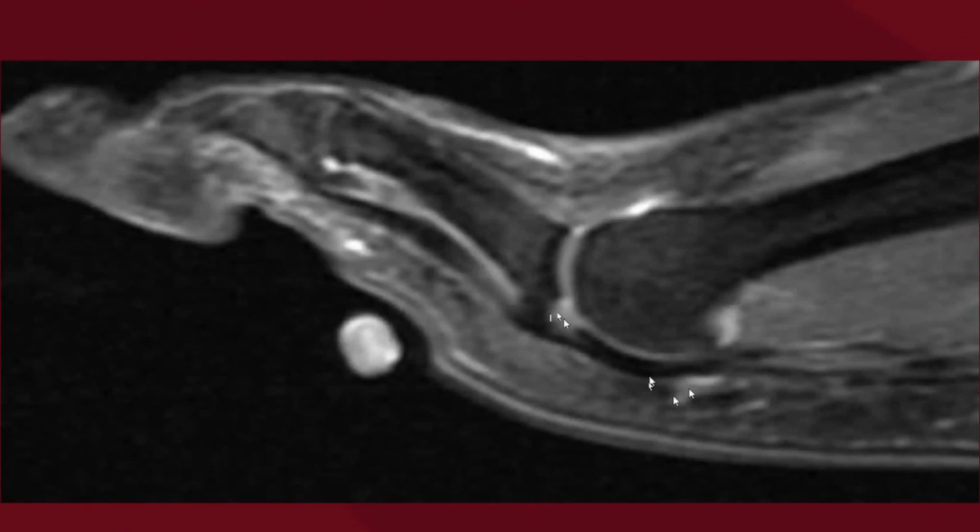So at the central aspect of the joint space, we have a normal recess that we can see from medial to lateral will seal up and become a formed attachment between the plantar plate and the proximal phalangeal base. But at the center aspect of the articulation, there is this normal recess that's usually on the order of 2.5 millimeters.